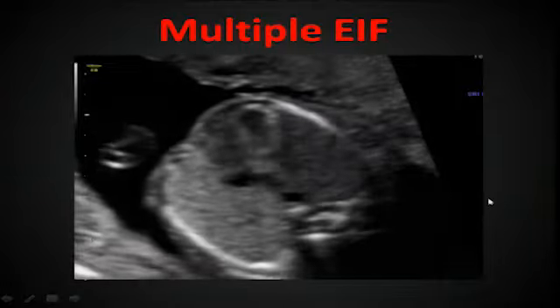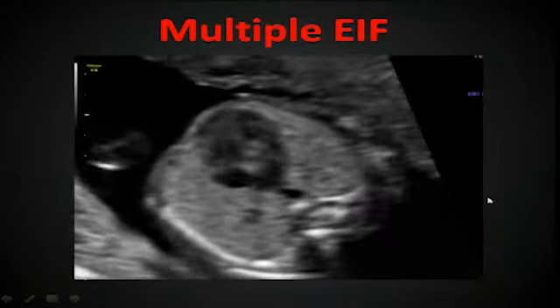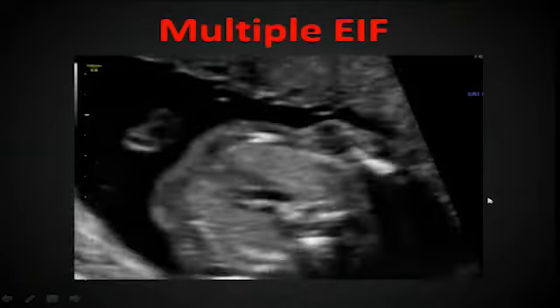And in order to qualify as an echogenic focus, it should be as bright as bone and you should be able to see it in multiple planes. Not just one plane, because you can create an artifact that makes it look like an echogenic focus when it's not.